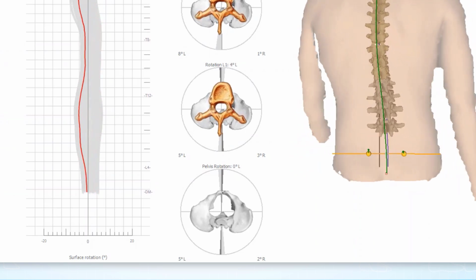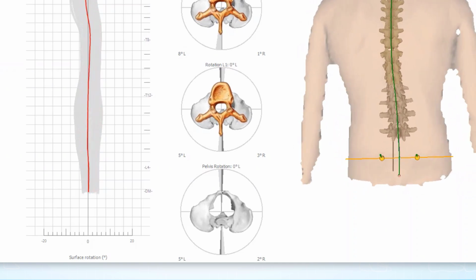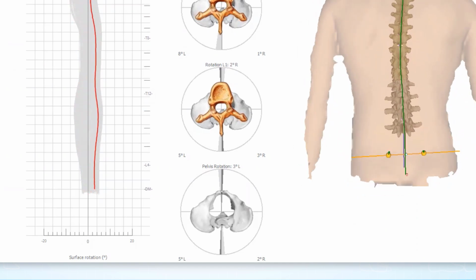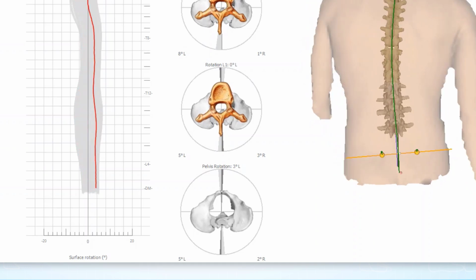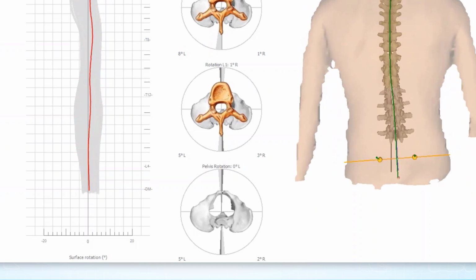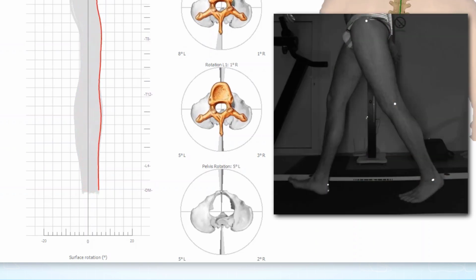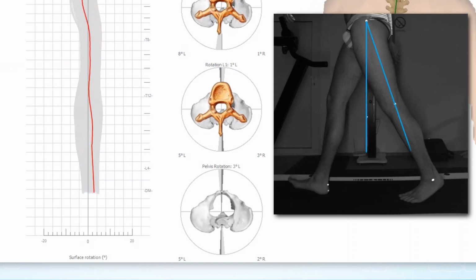The extent of movement of the pelvis in rotation is probably the easiest parameter to comprehend. The expected pelvis range of motion is about 10 degrees in total. These 10 degrees are divided into 5 degrees to the left and 5 to the right, and, as already mentioned, are required in terminal stance. At the end of this phase, the hip reaches its maximum extension of about 20 degrees in relation to the vertical of the recording plane.